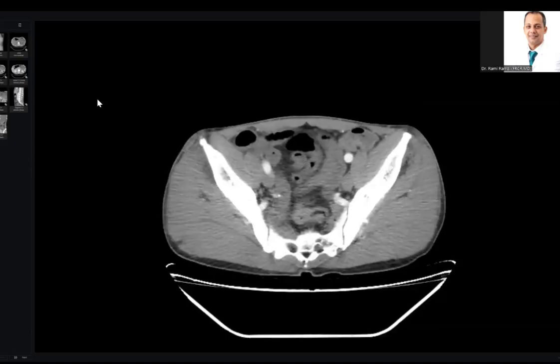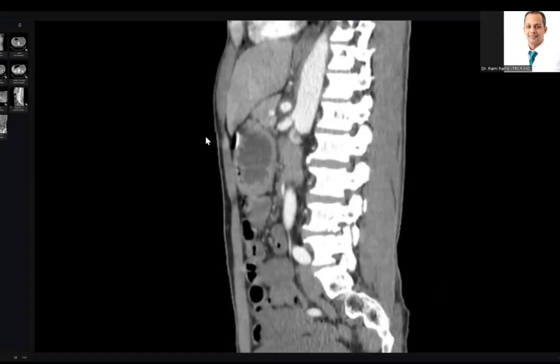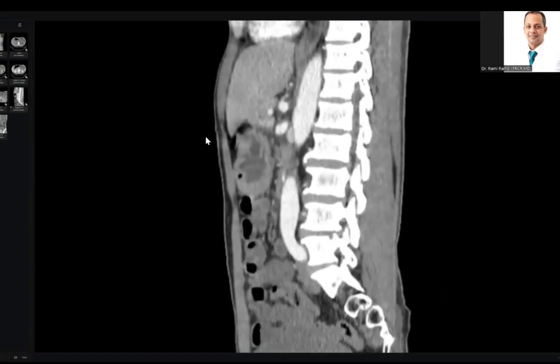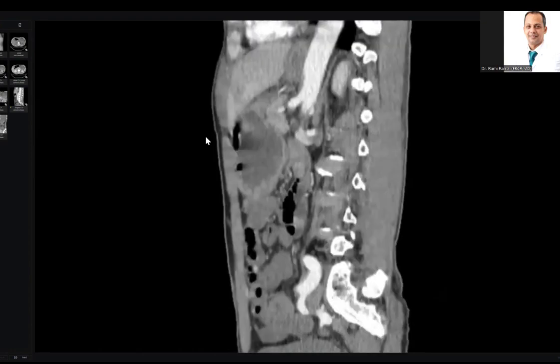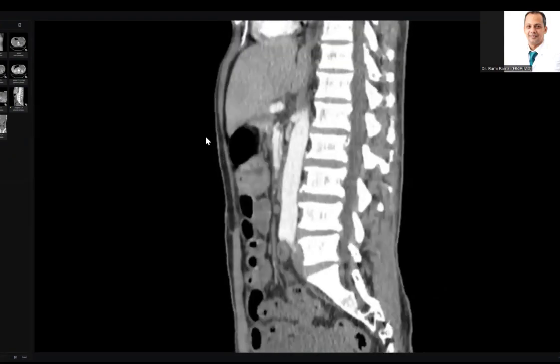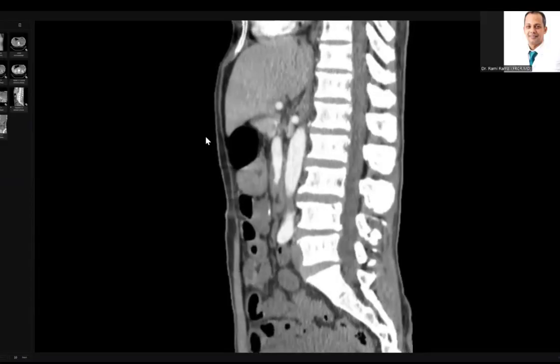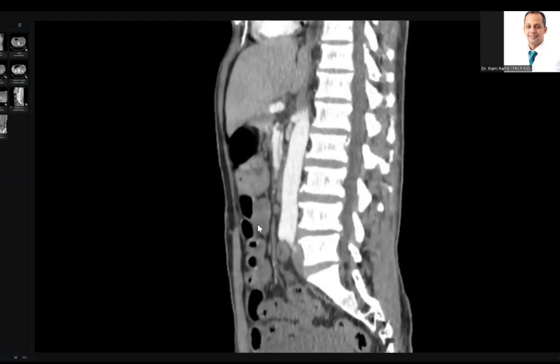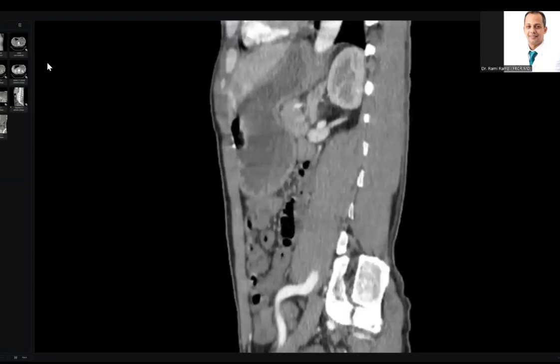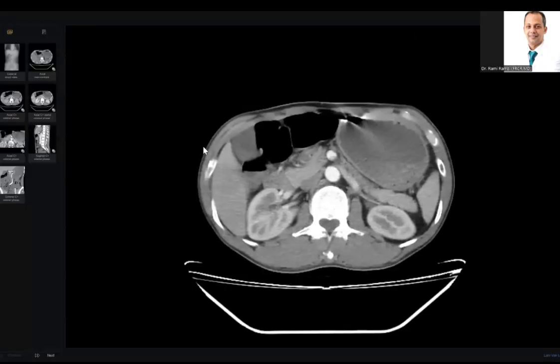So this is arterial ischemia due to superior mesenteric artery dissection. What's the next step? This is an emergency finding. I will call the referring clinician to communicate my finding, and this patient needs urgent surgical evaluation and maybe discussion with the intervention team for intervention.